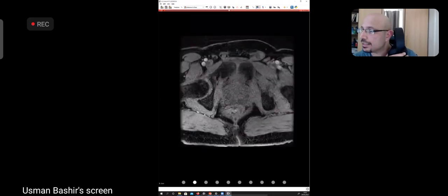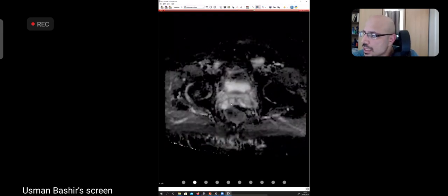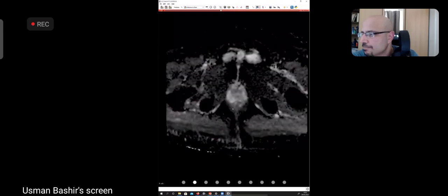So first one, I've looked at the diffusion weighted imaging. I have to answer this question before I move on.